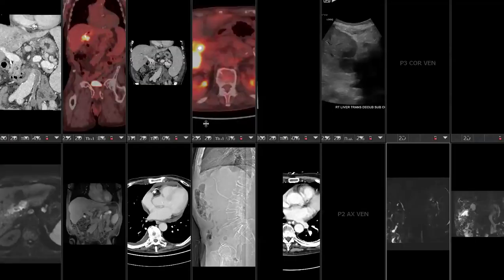This patient is a DCD liver transplant. So in all of these cases, we do MRCPs post-transplant. On the post-transplant MRCP, there was a biliary anastomotic stricture. So not ischemic cholangiopathy from DCD, more just anastomotic stricture. The patient also had elevated LFTs and white count, so signs of cholangitis. So they went ahead and did an ERCP, and they got frank pus out of this.